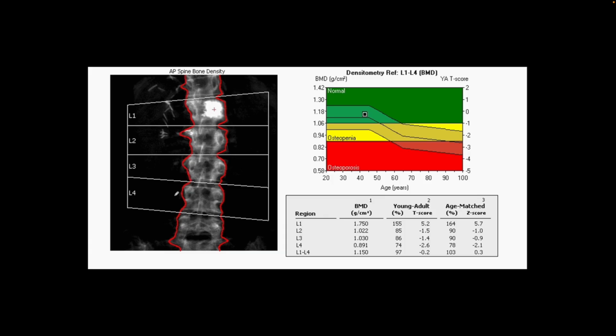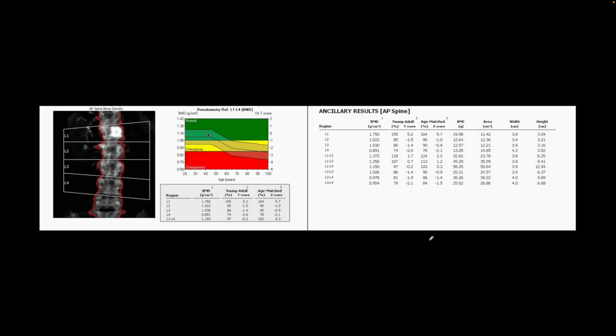All right, another DEXA scan. Here again, we find that the L1 vertebral body has an abnormality. It looks like they've had a prior vertebroplasty before, because of which there is very high T-score and bone mineral density of this vertebral body. We definitely want to exclude that and report L2 to L4. So here is the more data showing L2 to L4. And so this patient's BMD is in the osteopenic range, although they probably have osteoporosis because they have had an insufficiency fracture that was treated with vertebroplasty.